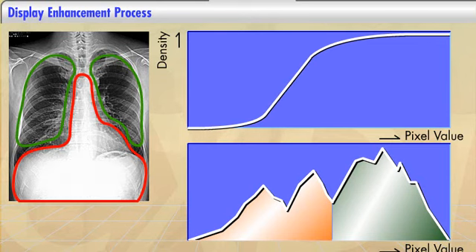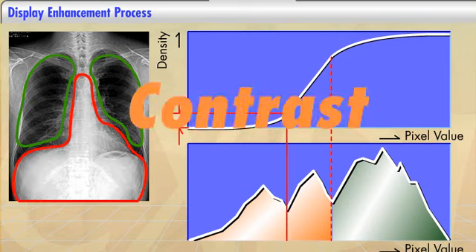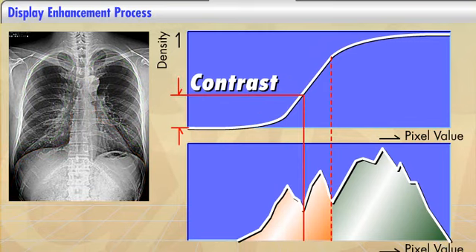Therefore, when it is placed on the S-curve for grayscale processing, the mediastinum area loses its contrast and the image turns white. In this case, the system compresses the grayscale in the region where the pixels have a lower value than the chest. In terms of the histogram, this is the region to the left of the broken line. This then increases the contrast in the mediastinum area.